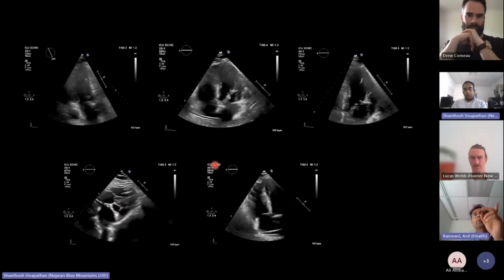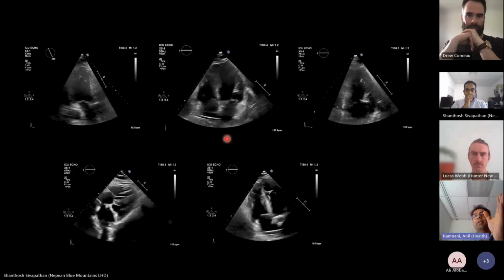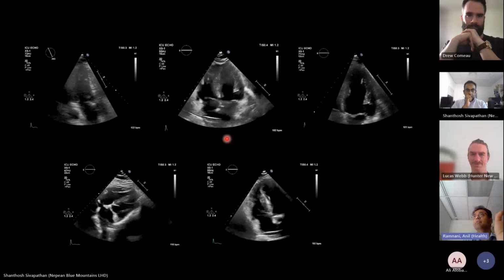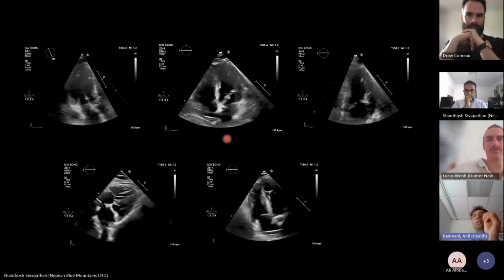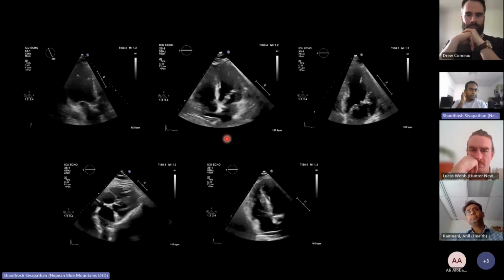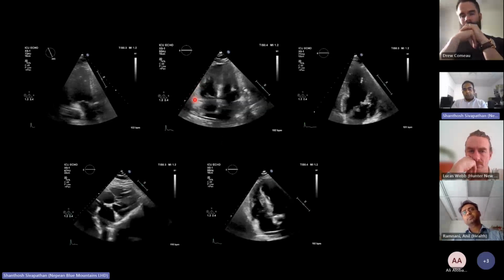A small disclaimer before you go to the money. I think I got waylaid by the fact that they angioed the LAD as well, but I now recollect the first sentence was it's just an inferior STEMI. So it's probably the RCA which was the culprit. Okay, sorry. That's exactly it. No, that's a good point. It's always important to have the clinical context in mind. But you're correct, I do agree with you.